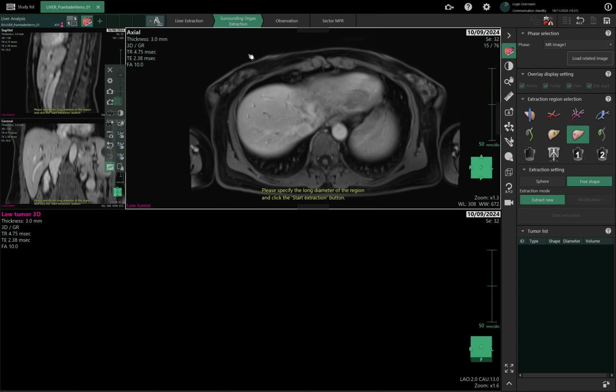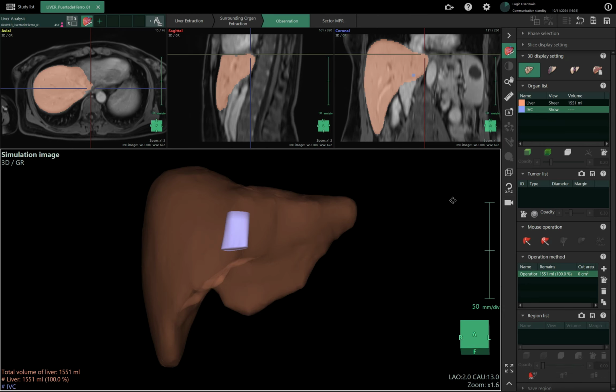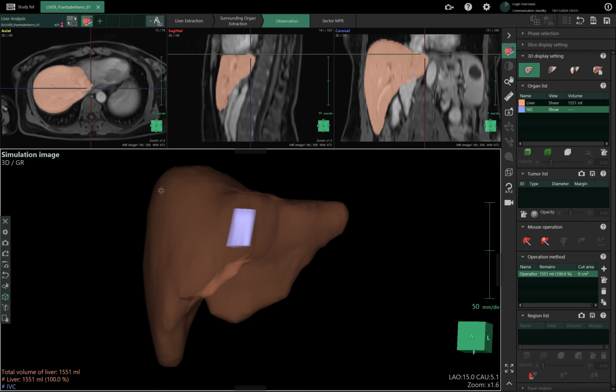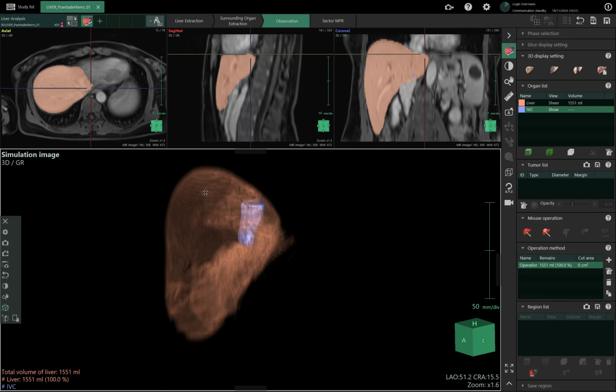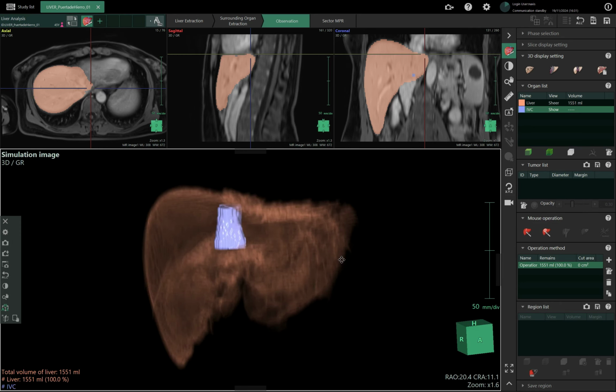I think it triggers a different approach, right? Trying to see how you can work with that MR. So there's a lot of interpolation. Yes, that's the thing here: you have interpolation. But if you come here to observation, this is what you have. If I go to this, you will see the 3 millimeter steps of those. If there's nothing else, that is what you will have.